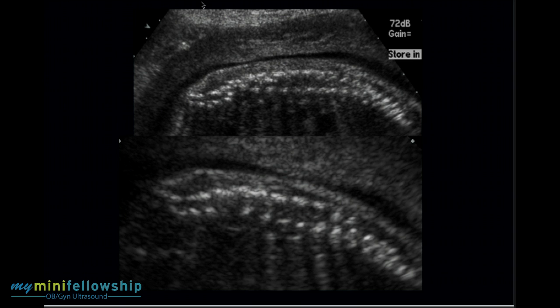So the initial picture looks like there are some abnormal vertebral bodies. Basically, here's the sacrum. So this is probably in the lower mid-lumbar spine, I'm going to say. Abnormal looking vertebral bodies. And what do you observe in this picture? Well, you've got sort of normal looking vertebral bodies, and then you don't see one here, and then you start seeing them again. That is correct. There's a gap here. That's an important observation.